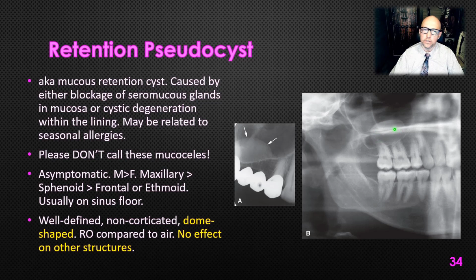It's really rare that these are going to cause obstruction of the sinuses. So these are things that you can just kind of note in the patient's record. But how would we distinguish these from those lesions I was just showing you that expand into the sinus and can appear similar? What's the difference between when something's just a soft tissue or a fluid-filled entity versus bone growing into it? A lesion that's a periapical lesion, or one of these other type of lesions that we'll get to later on in the course, an OKC, ameloblastoma, anything that arises from the bone, if it expands into the sinus and it's one of these slow-growing tumors, it'll have a cortex raised around it.